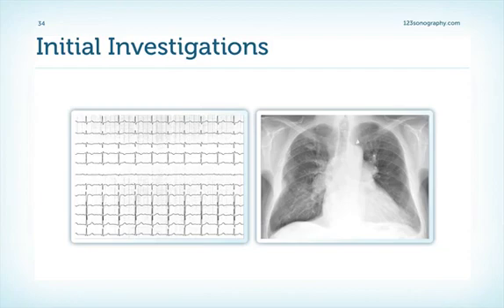So let's have a look at the chest X-ray, and first I want to show you the typical findings you can expect. And that's first of all dilatation of the central pulmonary arteries, which contrasts with loss of the peripheral blood vessels. Well, it has been shown that chest X-ray is not a perfect screening tool as well, but it's very helpful excluding lung diseases and left heart disease.